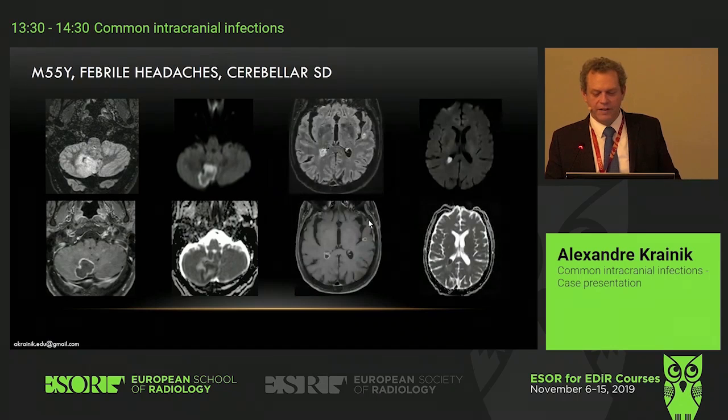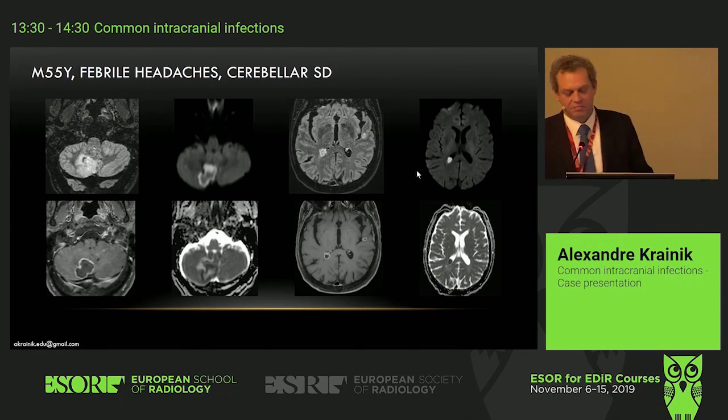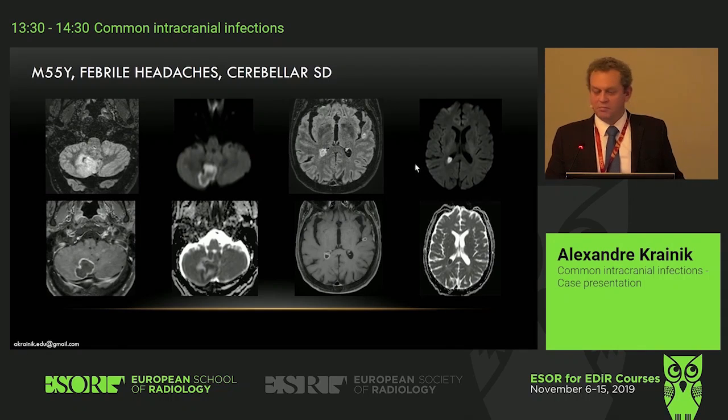It's got potential intraventricular lesions as well, that in left lateral ventricle, right lateral ventricle, and also a cortical ring-enhancing lesion in the temporal lobe.